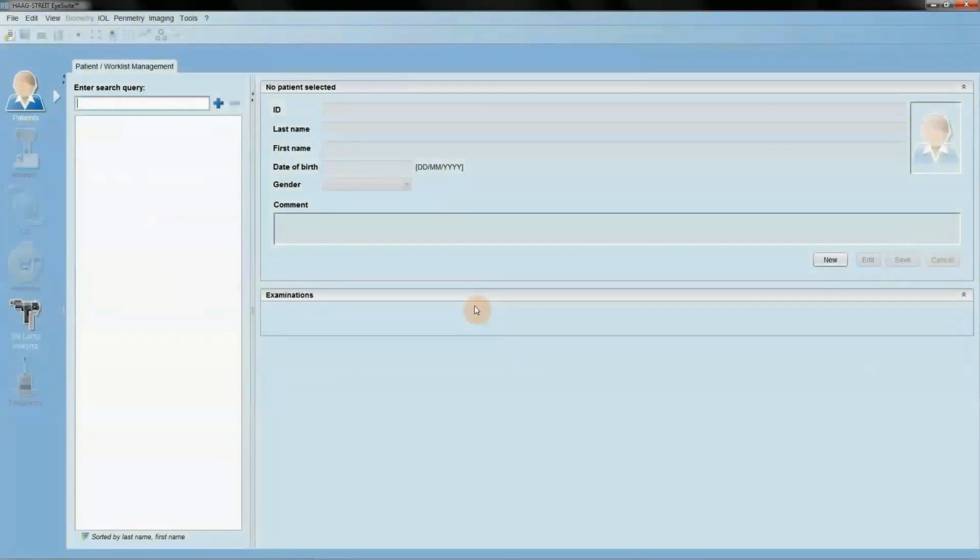Restoring the database. There are two options to restore a backup. If the backup was created with an EyeSuite version prior to i7.0.1.0, it will have the ending BKP, and will need to be restored with the function Restore from BKP. For backups created with EyeSuite versions i8.0.0.0 or newer, the Restore function must be used.